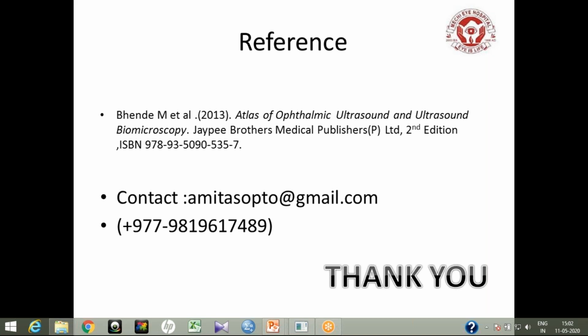And in silicone oil, we have to see all the quadrants, and never miss the superior and inferior quadrants. Because of its lower density, silicone oil moves upward, so there will be chances of retinal detachment in the inferior quadrant.